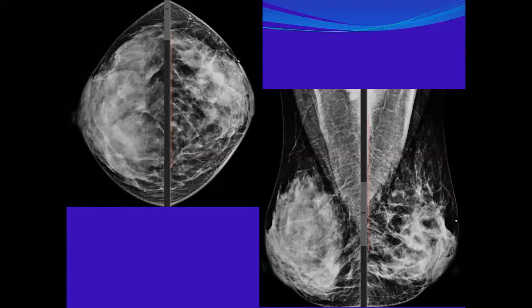To review the previous mammogram. Okay. Excellent. Well done. If the patient has a previous mammogram, you have to review it. It will help. Excellent. Well done. What else? And you said you are going to ask about the clinical history, which is important. Yes. Good suggestion. Okay. What else? I will ask about any history of surgery. Excellent. Well done. History of surgery.